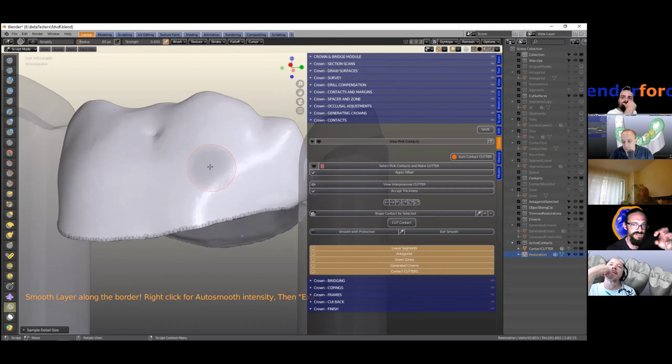If we mask protect it, we cannot alter it. So you just have to make a small sculpting around this mask-protected contact area. And so it will be very easy to have some convexities, because we like to have convexities against convexities; concavities against concavities, you say, it's just like a tooth decay trap.